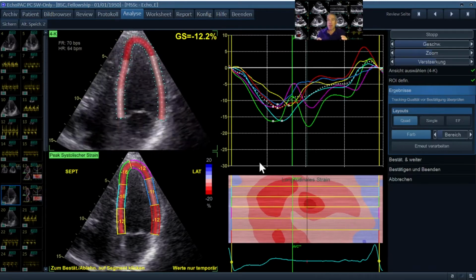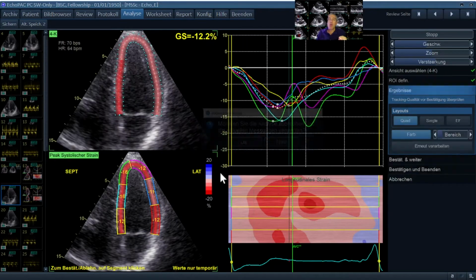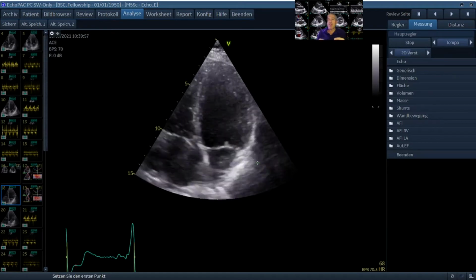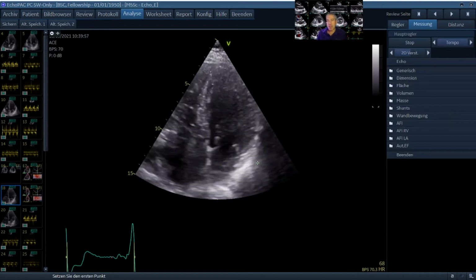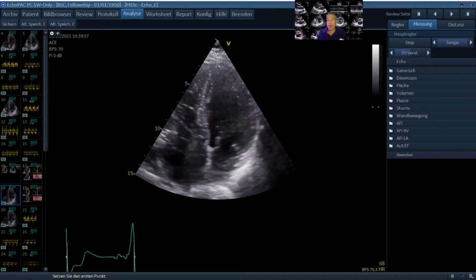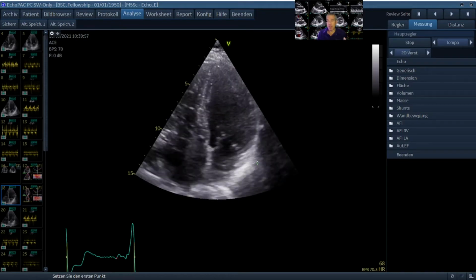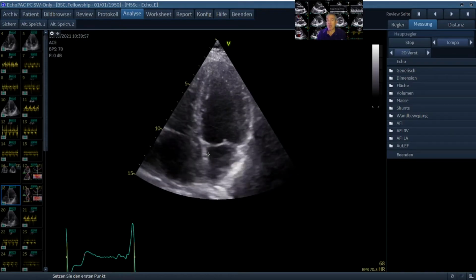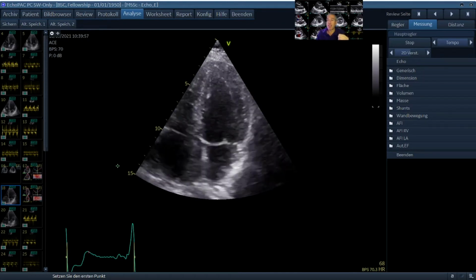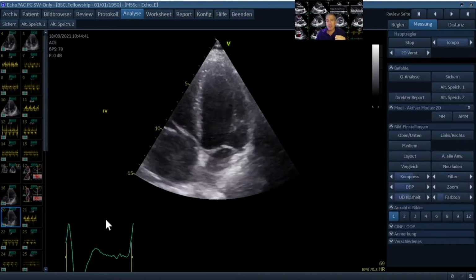But what would happen if the left ventricular lead fails? What would happen if we have an exit block of the left ventricular lead, or maybe if we would have just right away implanted a conventional older right ventricular pacemaker in this patient who's presenting with left bundle branch block? So we will now look at the effect of conventional right ventricular apical pacing. And this is this setting here.